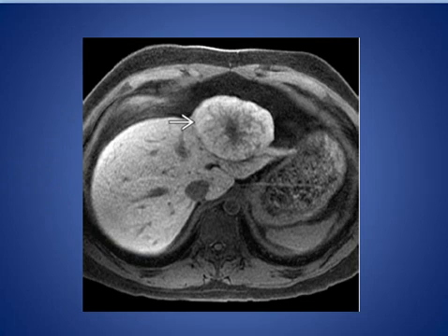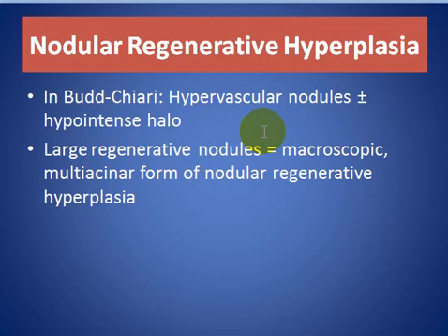And this is another patient with focal nodular hyperplasia, and this is the delayed phase. Contrast enhanced MRI shows an exophytic mass lesion that retains more contrast, and it is brighter than the background of the liver. As we see also the central scar and the pseudocapsule of the dilated draining vein in this area. And this is the pseudocapsule, it is not enhancing.